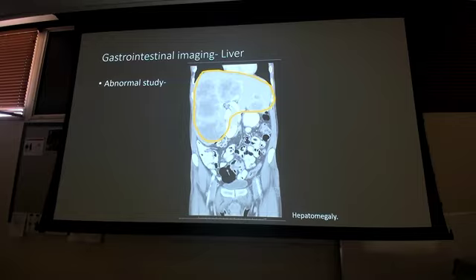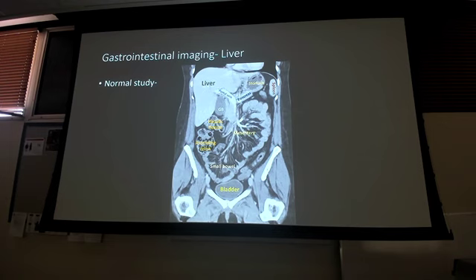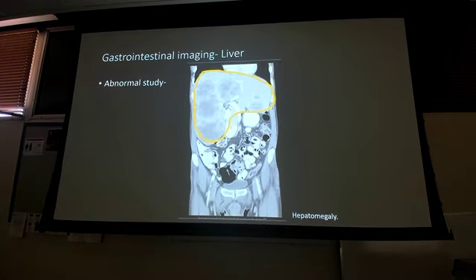No idea. Probably cancerous because these aren't like the cyst that we saw on the renal cyst, right? Where it was a clear kind of radiolucent fluid. So probably hepatic carcinomas, but I don't know. Biopsy will tell me that answer. You'll learn that in GI. But what I need you to know is this is what a normal liver looks like, and this is what an abnormal hepatomegaly looks like.